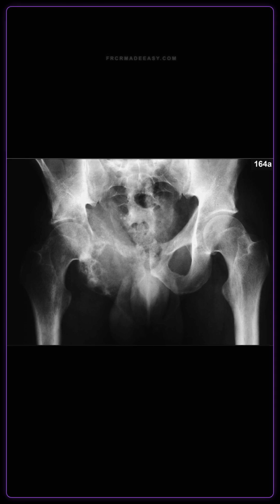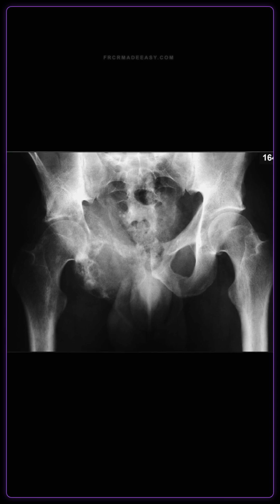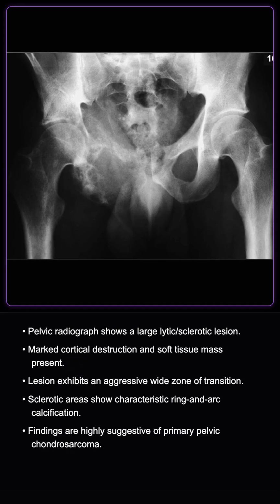A 34-year-old male presents with deep, progressive hip pain. I am showing you the pelvic radiograph. Describe the findings. All right, let's take a look.